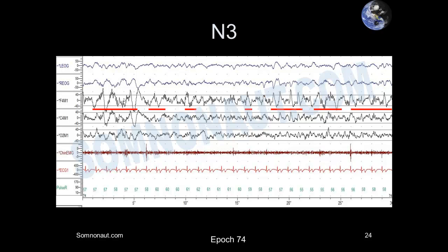I will go back to here. Fortunately, there is an algorithm to determine the height and relative weight of the EEG tracings. It is called Z ratio. In future videos, I will be elaborating on this way to quantify the EEG along both the frequency and voltage domains simultaneously. To whet your appetite, I will briefly explain.